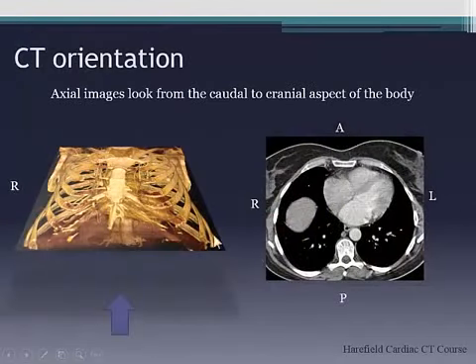Okay, so remember from the axial image, as Taryn's already said, you're looking effectively from the feet upwards. So what you have to remember is anterior will be forward, posterior will be back, and right and left as per chest x-ray.